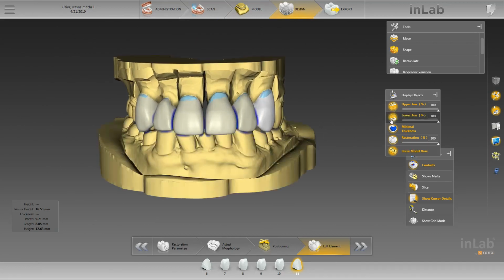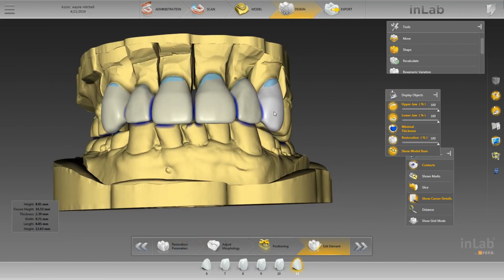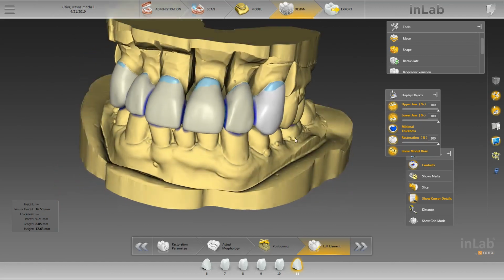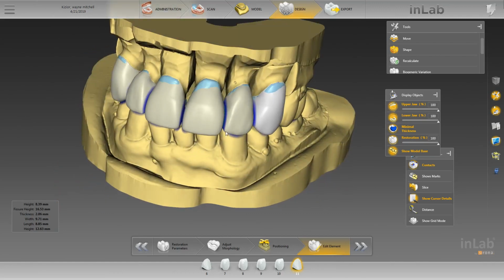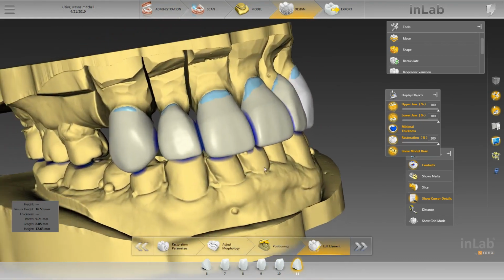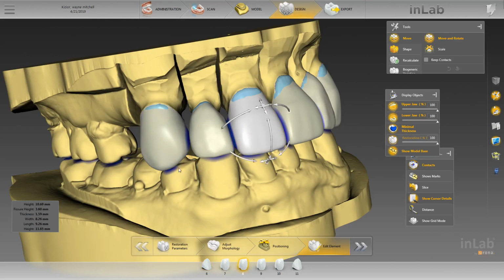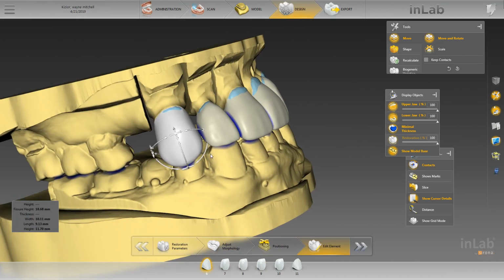Okay, onto the cuspids. We've got no contact here, and this is where we're gonna want contact on these cuspids to kind of keep occlusal interference away from the laterals and the centrals, which are weaker teeth. So let's bring these down, and we may need to flatten out these cuspids. They may have a flatter design or flatter appearance, which is okay at the incisal. It'll kind of match the opposing. So we'll lengthen those just for now to get them into contact.